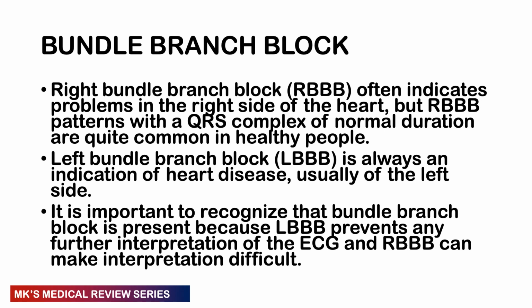So it may not carry some pathological implication in some people. But with the left bundle branch block, if you see one, it almost always indicates that there's some sort of heart disease. It's almost always pathological. And we usually see that there's a problem on the left side of the heart. I'll talk about left bundle branch block in a separate video. In this particular video, we will focus on right bundle branch block.